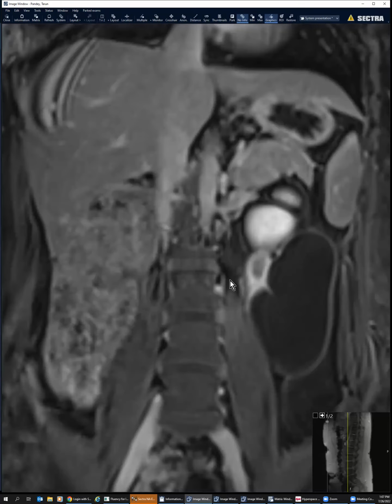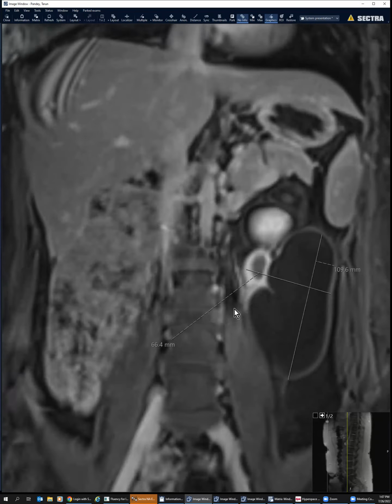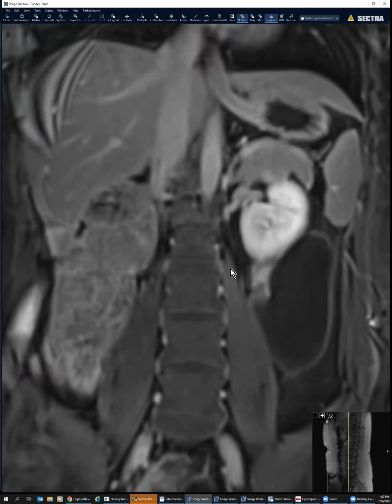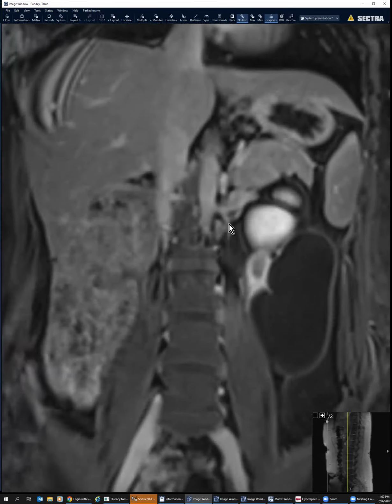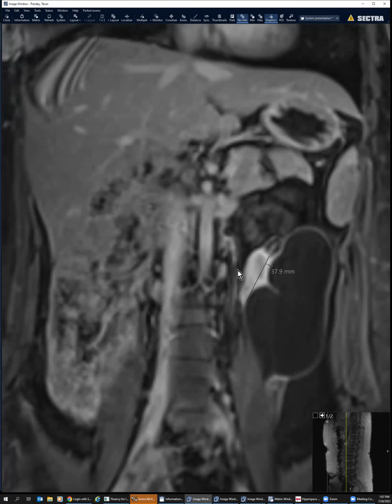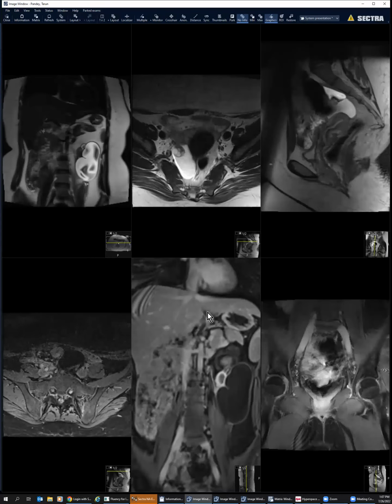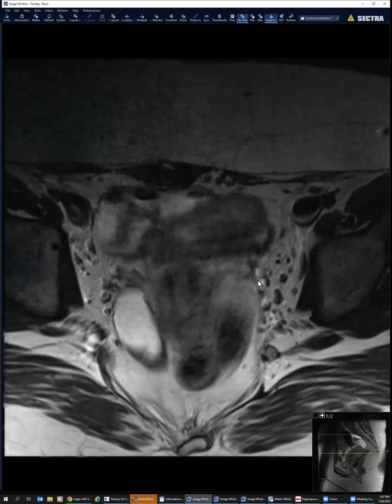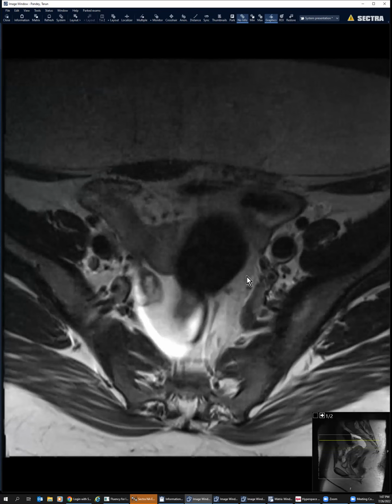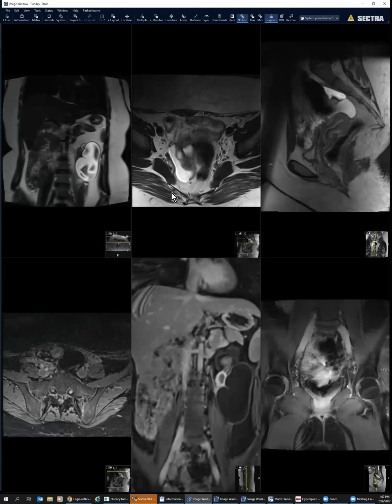Can you trace the gonadal vessels? It's very tough. You can see here, right there. Yeah, it goes to it. The left gonadal. So the thought process here was that since one ovary is missing, we really could not find it in the pelvis. So what if this is an undescended ovary? And this is a young patient, has got chronic abdominal pelvic pain.